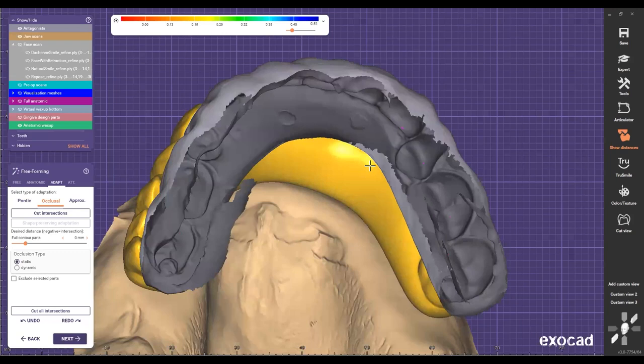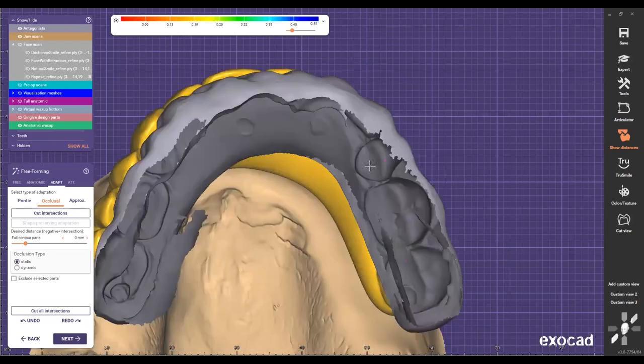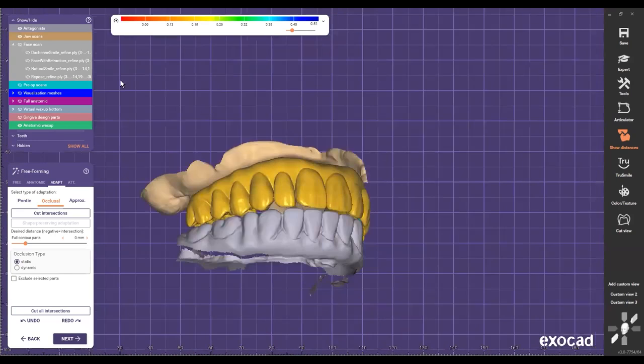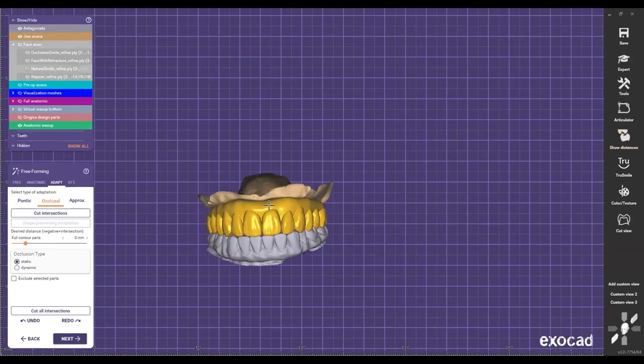Make sure when you put the supports, if you're printing, that you remove the supports properly. Use loops and get the handpiece and just grind where the supports are. Don't grind too much and don't polish too much, otherwise you're going to get rid of the contacts. If you're milling, that's not a problem. Just don't put too much glaze, just a thin glaze layer there, and that way you preserve the contact points, okay?